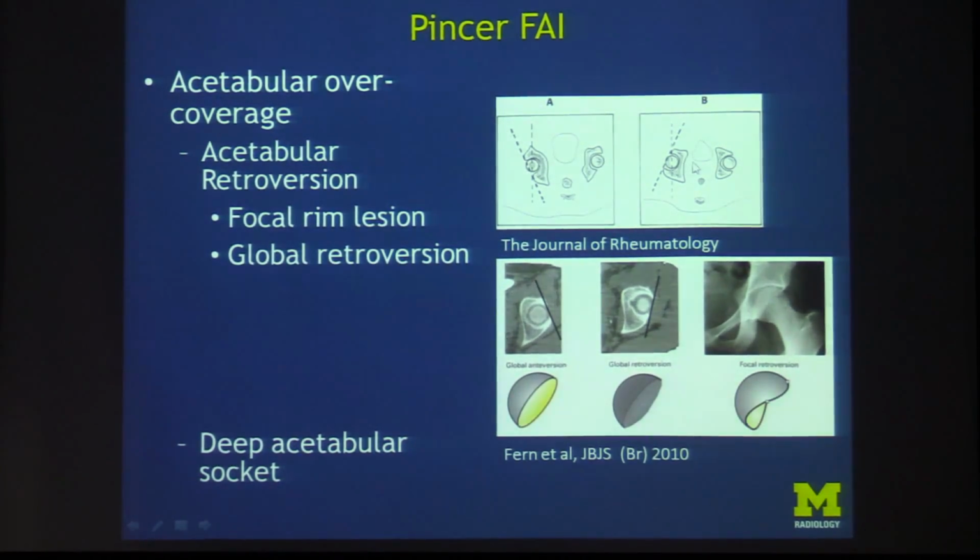Now here's a schematic showing you acetabular retroversion compared to anteroversion. Retroversion could be focal in the anterior superior margin, as seen on the schematic here, or global, as seen in the schematic here.